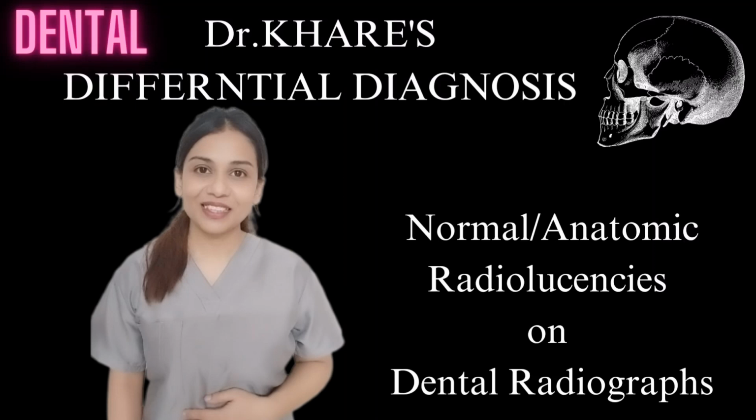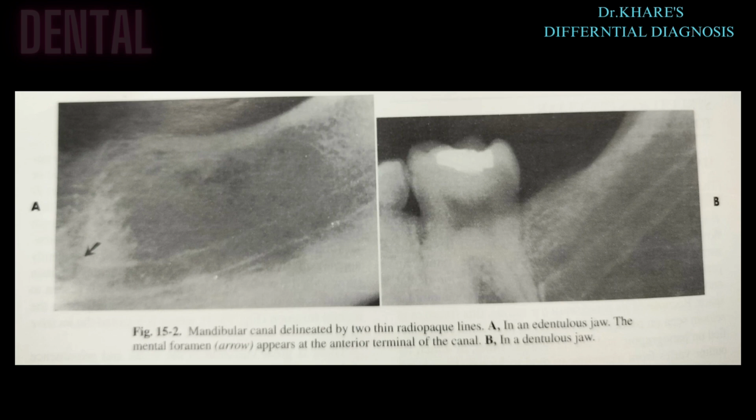Today we are going to learn normal or anatomic radiolucencies seen on the dental radiograph. So this is the intraoral periapical radiograph of mandibular posterior region showing mandibular canal. Mandibular canal delineated by two thin radiopaque lines can be seen. Radiograph A shows canal in the edentulous jaw while radiograph B shows canal in the dentulous jaw. The mental foramen appears at the anterior terminal of the canal.